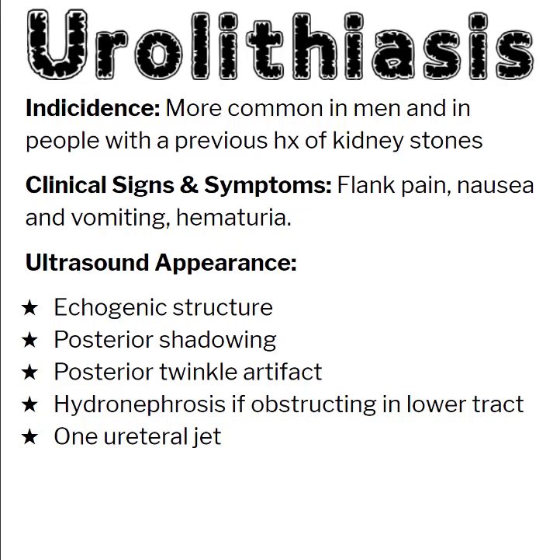Now, it's more common for men to have stones than it is for women, and if you have a history of kidney stones, you're more likely to develop kidney stones again. These patients come in with extreme flank pain to the point where they're nauseous and possibly vomiting, and there's often hematuria, or blood within the urine. On ultrasound, we're not super good at detecting the smaller stones. We are pretty good once the stones are large enough to be detected with the physics of our machine and to produce enough of a shadow that it catches our eye.